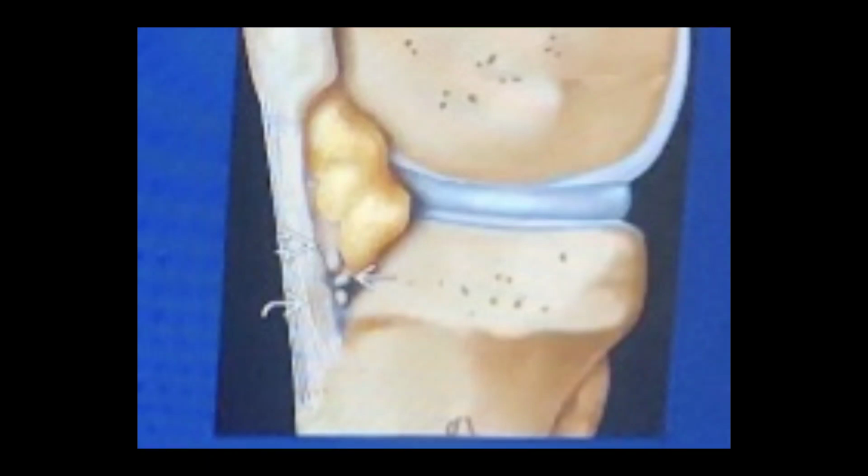Here on this image, it clearly indicates that beneath the patellar tendon there is ossification, and because of the ossification there would be traction fragmentations as well. This is another lateral view, and here you can appreciate that where the patellar tendon inserts, small fragmentations of the tibial tuberosity can be seen.